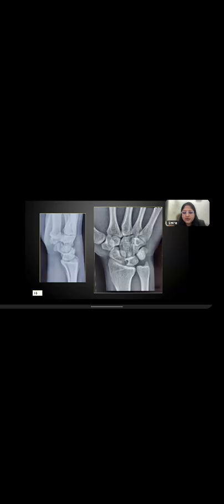No, it is not avascular necrosis. Avascular necrosis of the lunate looks more sclerosed. The density of the lunate is increased in avascular necrosis. Osteoid osteoma, no. Osteoid osteoma is a cortical sclerosed kind of structure. Perilunate dislocation, no. Cyst. Finally, somebody saw this. I have been pointing at it with my arrow. So this was a ganglion cyst which was causing external erosion of the lunate.